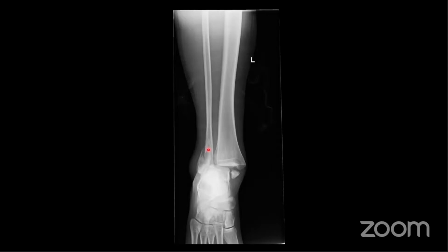Yep, all good points. Like how someone said, relocate it. Yep, although as a radiologist, I wouldn't be touching that. Image the knee. Yep, good.